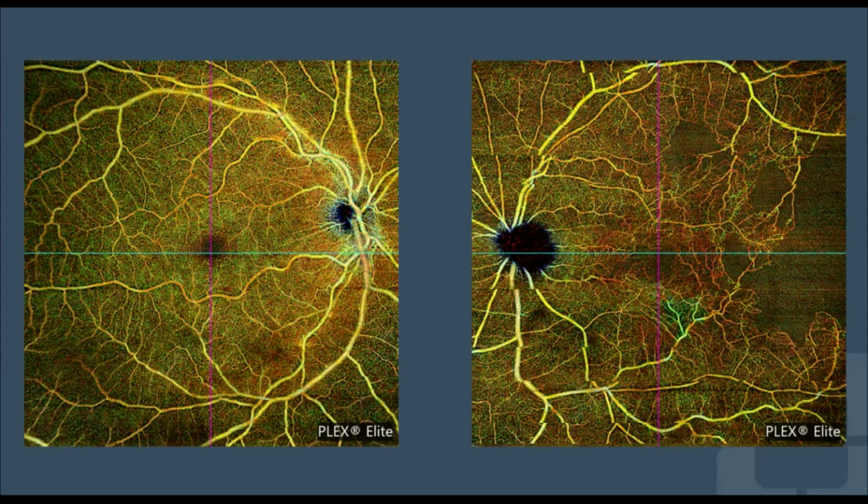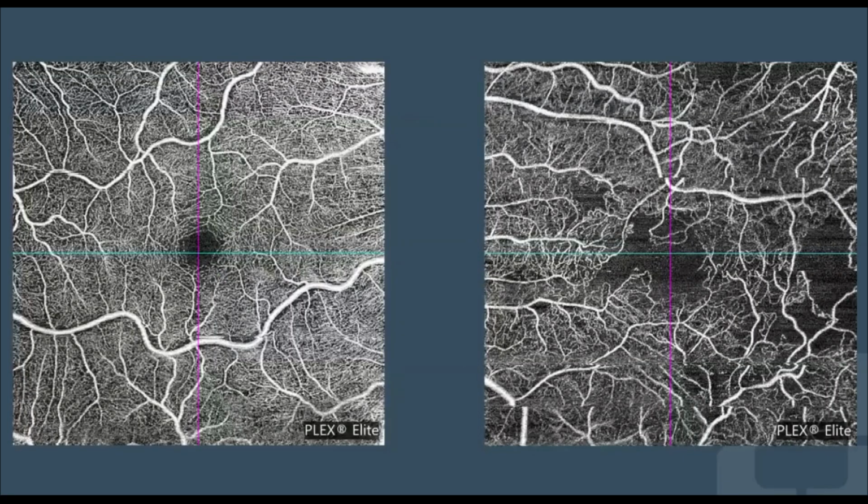And think back to that fluorescein angiography. It really looks much more pronounced, and you can get an idea what's happening more at the macula and foveal level. And compared to the normal right eye, there is all this ischemia, not only in the temporal macula, but also centrally. And let's see if I can advance to the next.